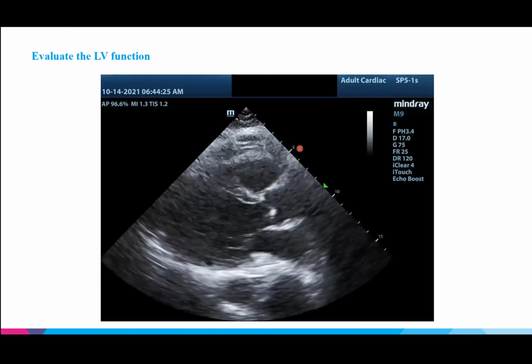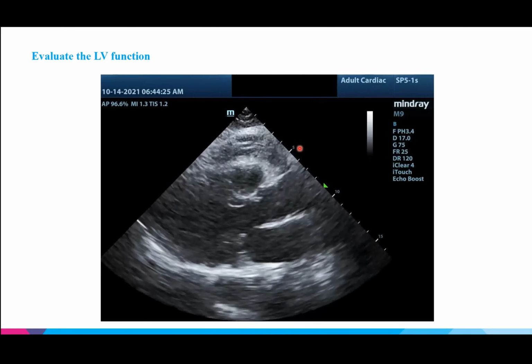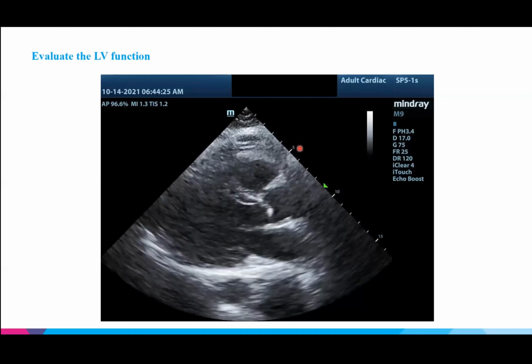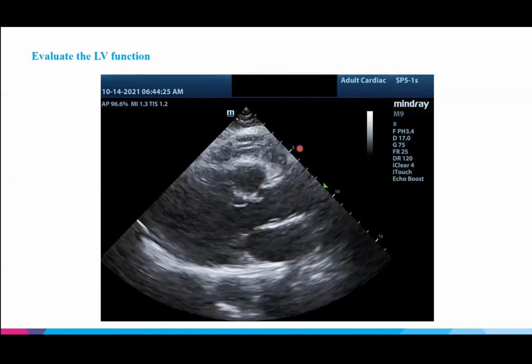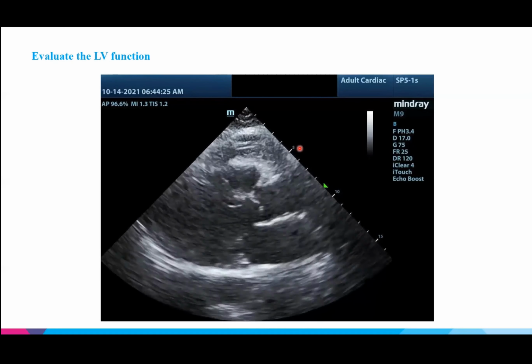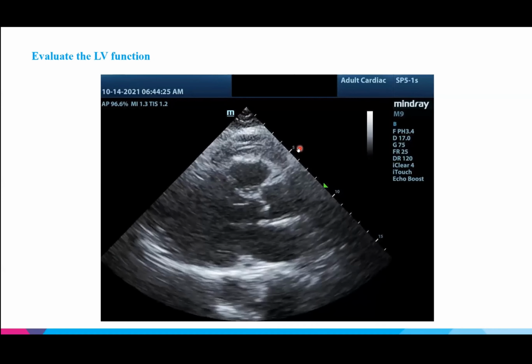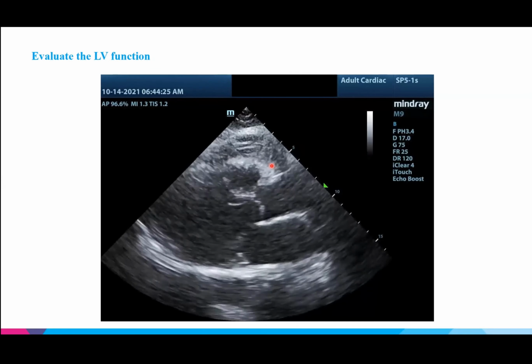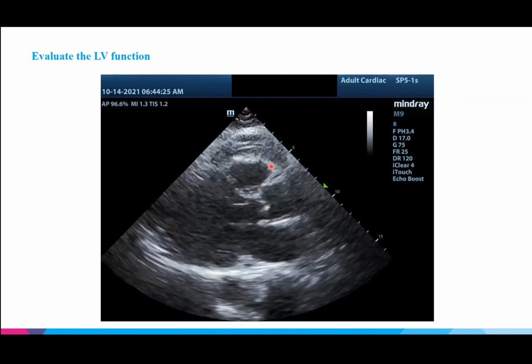Let's see. So waiting on a few more. All right, so we have 54% saying normal, and then there's a mix between reduced, severely reduced, and maybe a couple saying hyperdynamic. So again, this maybe is not the most ideal view, but what are we looking at here?